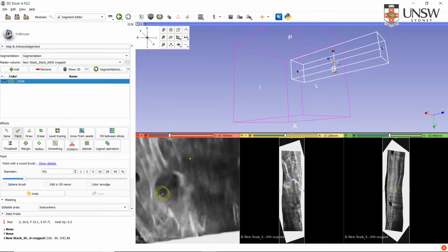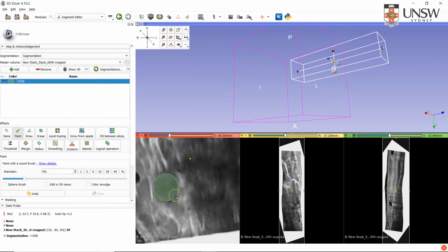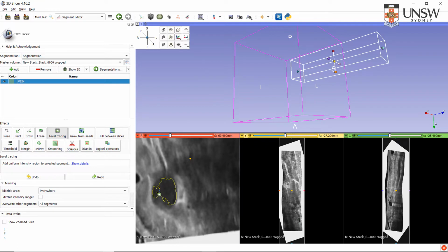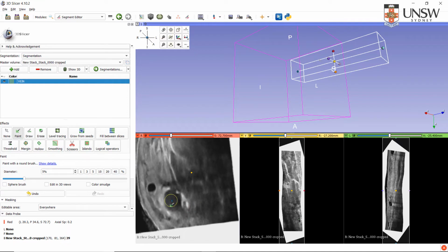So when you capture the image, if you can draw it perfectly, that would be great, but if you can't, you will do smoothing at the end, where you will be able to fix your image essentially. So if you look at this picture, you can still use tracing. Tracing will be just tracing the lumen outline, but it will be tricky when the threshold is not clear, so you'll get other parts here that you don't really want. So we will just stick with paint. Paint is quite taxing, but it will do what we need for this geometry for your assignment.